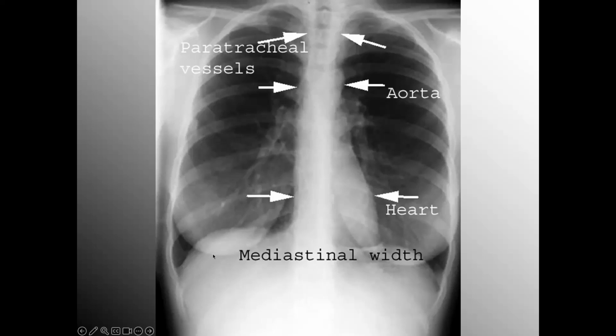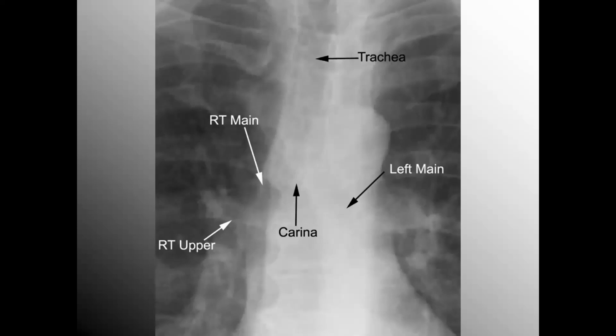What you're seeing here is a little bit of darkening of this particular area. You've got breast tissue overlapping the diaphragm. They're both kind of similar density as far as the tissue is concerned, and it darkens where the overlap is located. And you're seeing an example of that. It's not a perfect silhouette because you can still see the borders of each. The only time you lose the borders of 2 overlapping structures is when they're in very close proximity to one another, almost touching, if you will, and you have the densities that are equal. And we're going to look at that coming up a little more.